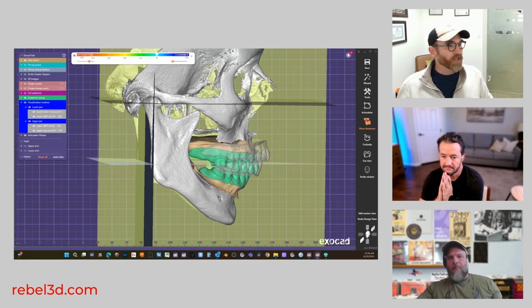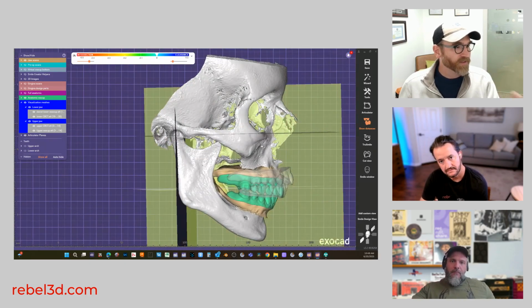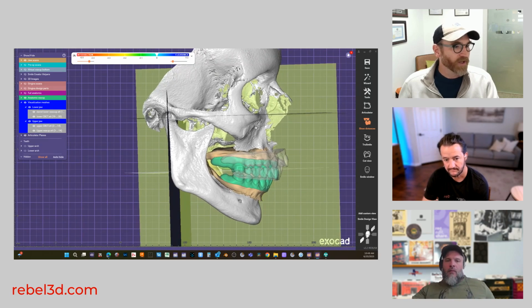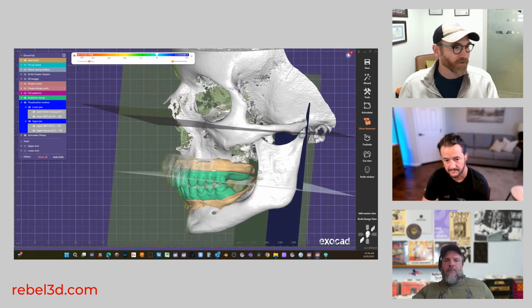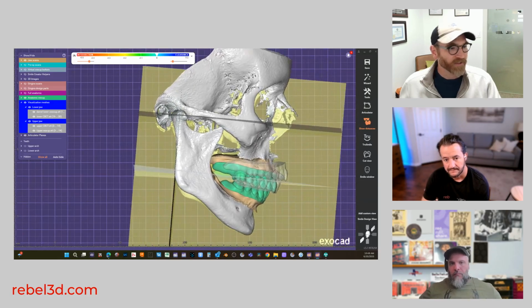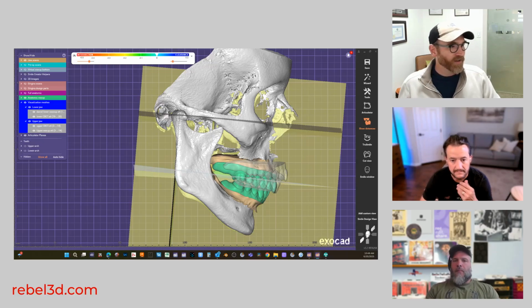Looking at this screen, this is a great practice for a clinician. If I have a designer doing a wax up, I will go ahead and remount the case like this. I'm looking at what kind of stuff I'm seeing here, where my errors are going to be as far as how I captured the bite. And then I always have this common reference zone, reference place. So I think this is a clinical procedure, mounting the case.